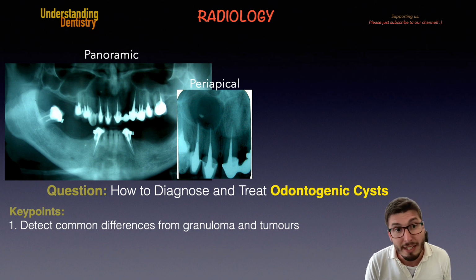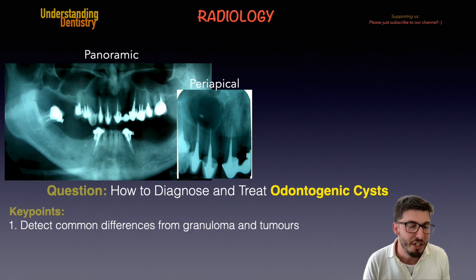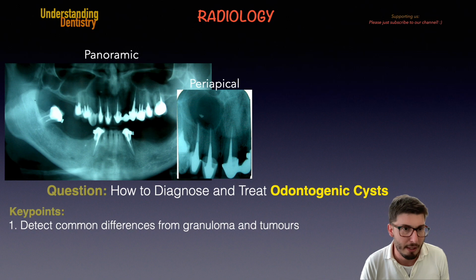But again, we are seeing the periapical radiograph, so now we can see in better detail the lesion. And we are seeing also that there is a radiopaque area inside the lesion, which is suggestive of endodontic material, right? So the obturation material, maybe the obturation was overextended, and then we have a little bit of endodontic material inside the lesion, okay? And that's why the lesion on the periapical radiograph is not so homogeneous. So we can also expect a little more infected aspect because of that. But we still need to plan the surgery, right?